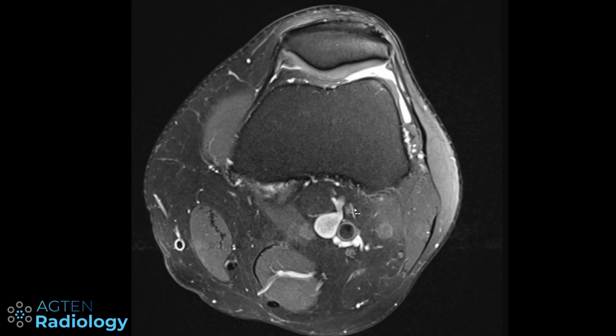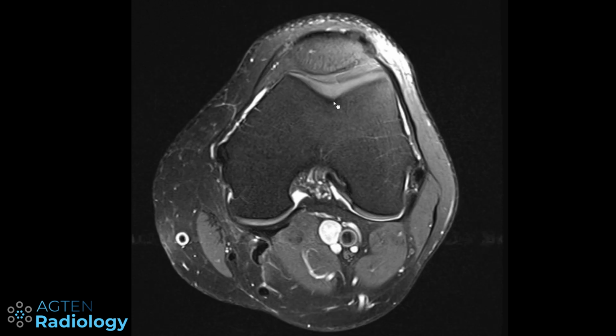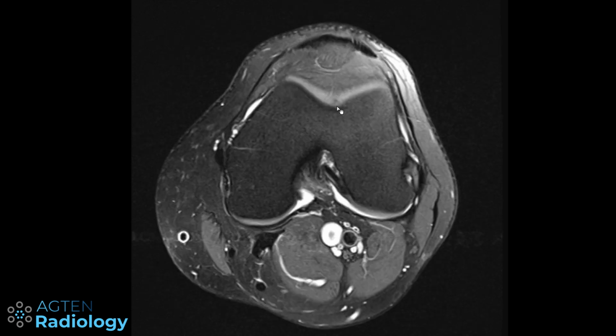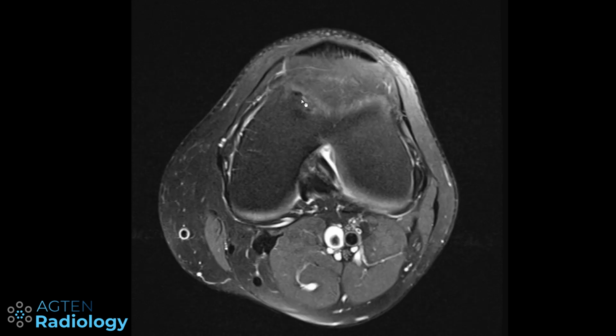Before we close up here, let me just show you a very important differential diagnosis. Let's have a look here at this case. This is again a proton density weighted fat saturated sequence, and if we scroll down here at the level where we would expect a black line, we see maybe a little bit of a change here in the cartilage actually. And if we go further down, you can see some changes here. So you can see a black sign or a black cartilage or something black in the cartilage rather.